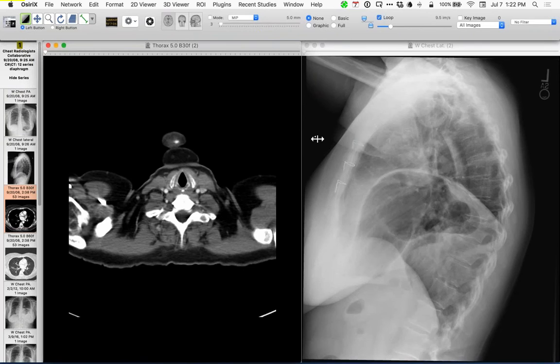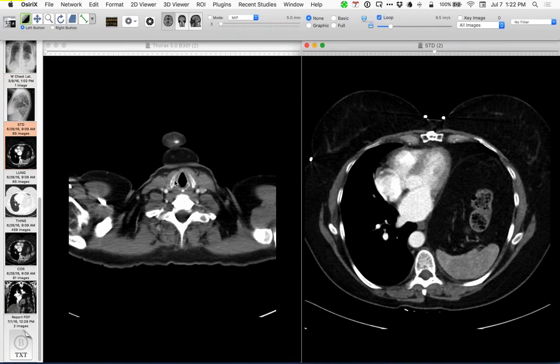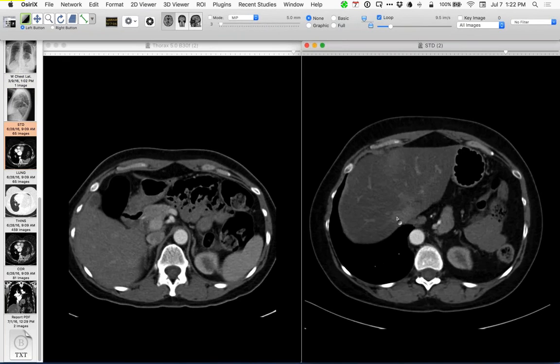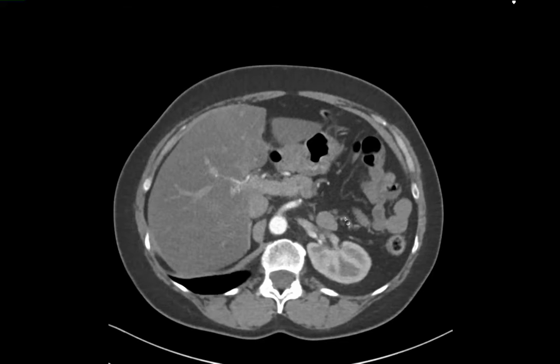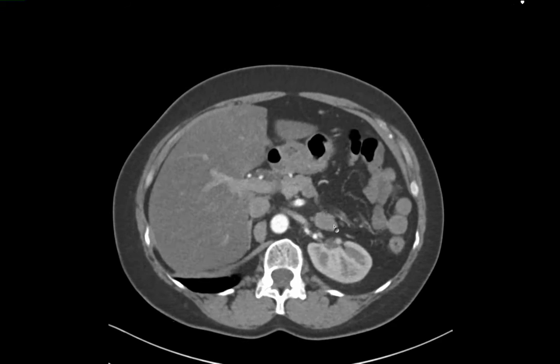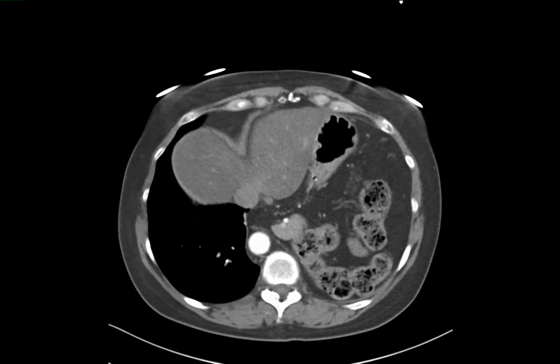So of course, I'm now going to show you the crus so we can look at the comparison there. Let me bring up just the standards alongside each other and see if this will scroll separately. So let's go back to before surgery around about here, and more recently there is the crus on the right side, and sure enough, looking for the one on the left, it's very, very small, really hard to see. It's almost non-existent. Just scrolling back and forth where it should be, comparing it to its companion, it really is very thin. So another super nice example of that phenomenon.